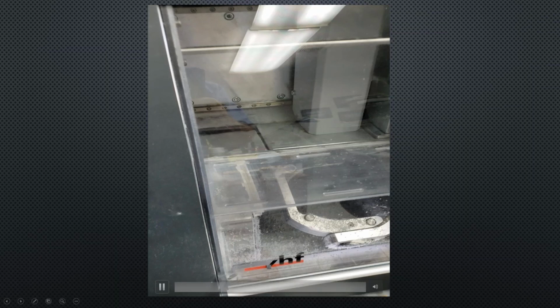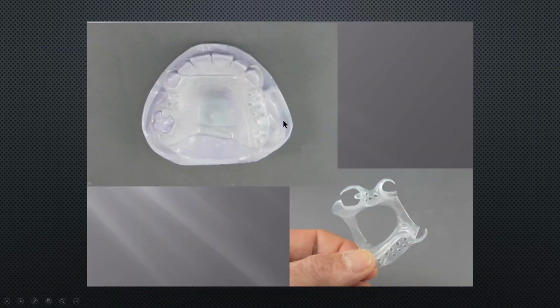And then once it comes out, it'll really be close to polished. The texture and the surface is really, really nice. But there is a polishing kit that's available through Myerson, because they have an injectable version of VisiClear, and those you really have to polish. They come out pretty rough when you're finishing, and it does a great job. You'll literally spend 2 minutes to give this a little high shine because the surface is already so smooth.